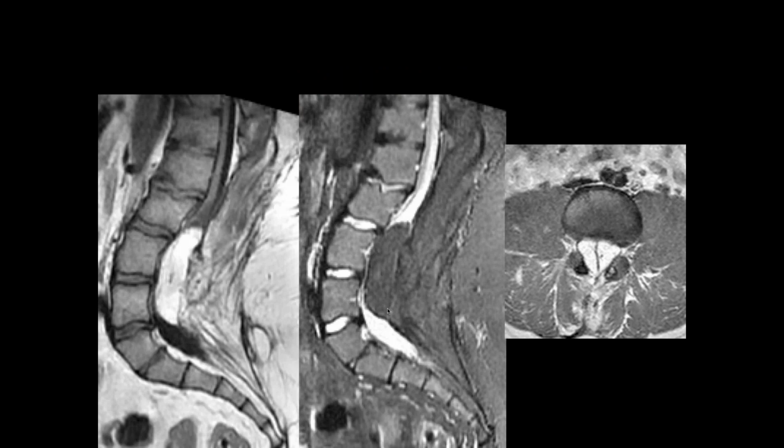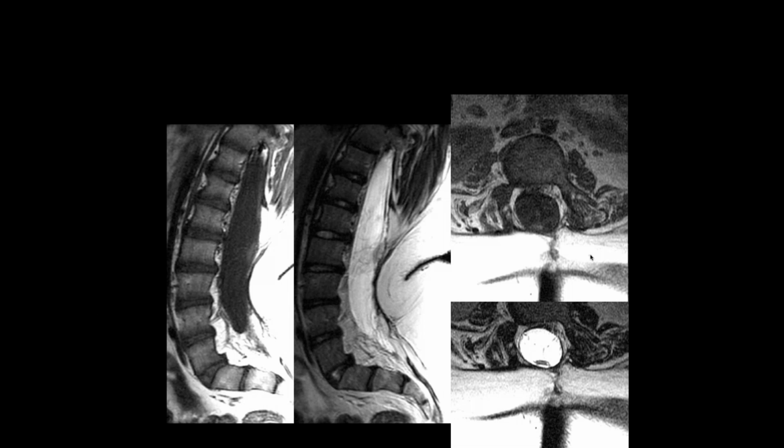As opposed to this, Shiv, what do you think of this? Okay, it looks like there's a mass in the spinal canal, and it looks like it's T1 hyperintense and T2. It looks like it fat sets on the T2 fat sat or the STIR. So it looks like a lipoma. Yeah, so this is really an epidural lipoma, which in this case really is markedly compressing the neural canal. Right. And going further here, Thomas, what do you think of this case?